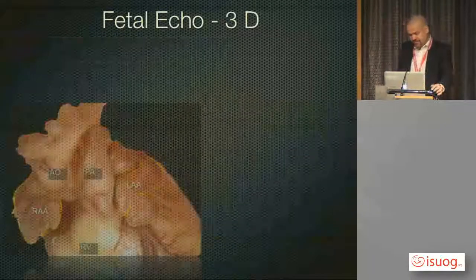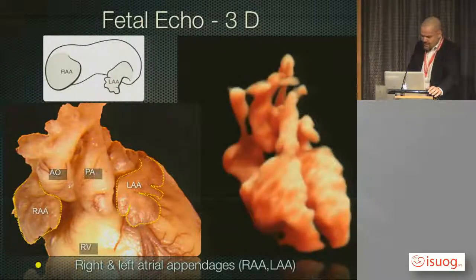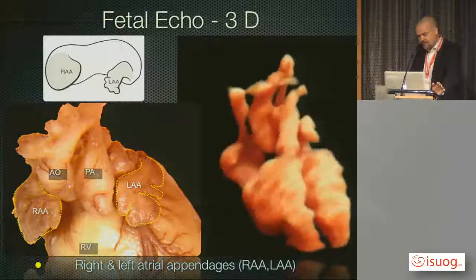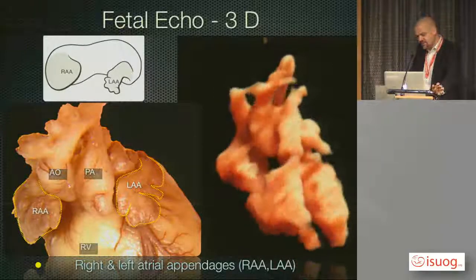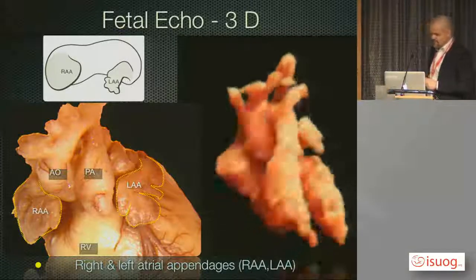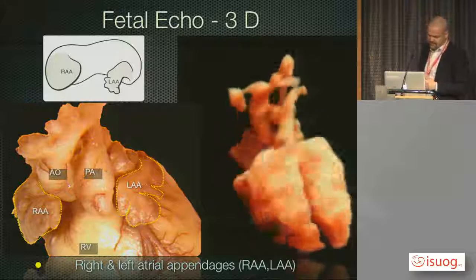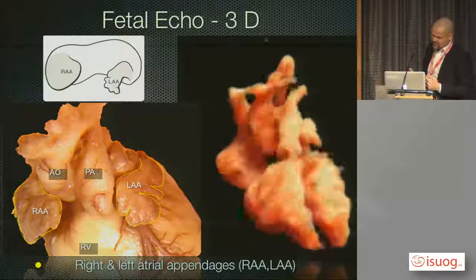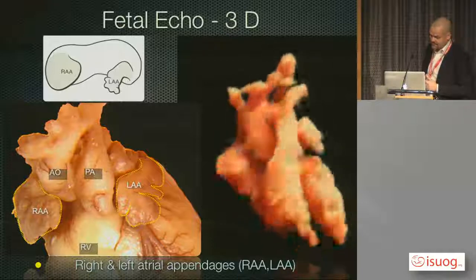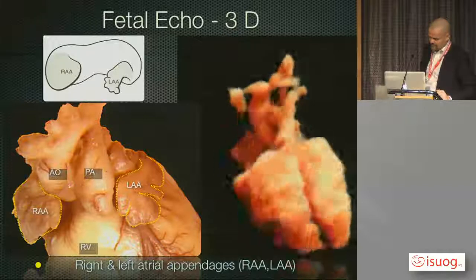From the pathologist we know such strange things like heart ears, and the STIC technology allows us to see the heart ears. This is in STIC volume displayed in inversion mode, and you see the heart ears and also the overcrossing of the vessels. And sometimes we use technologies like this in the differential diagnosis of fetuses with heterotaxy syndromes.